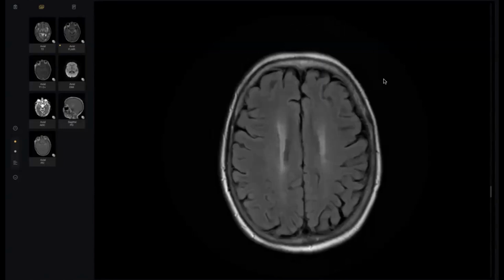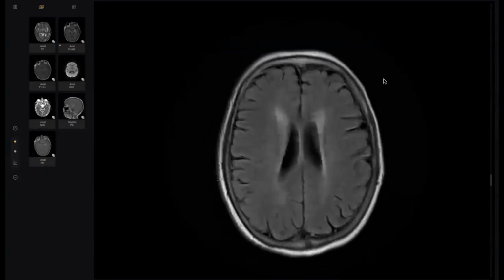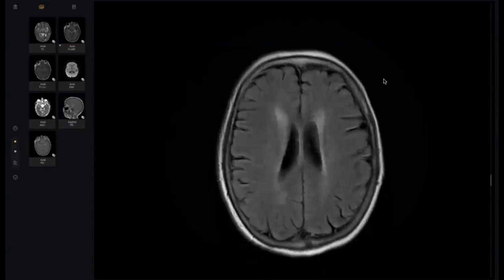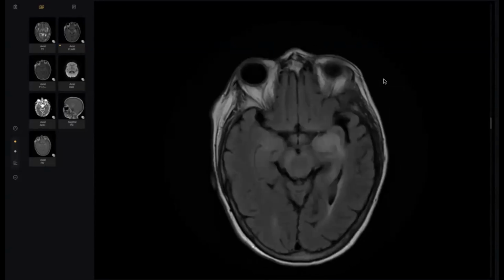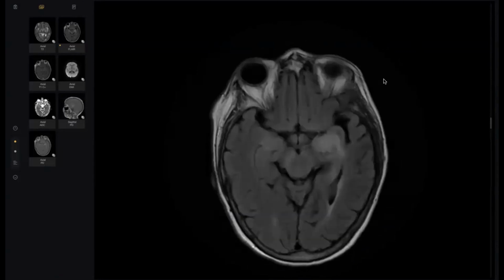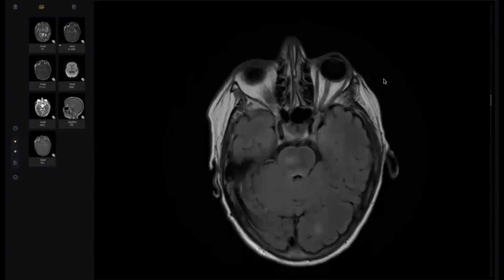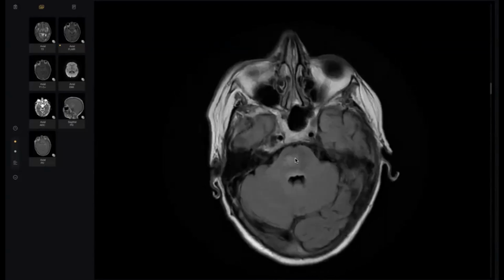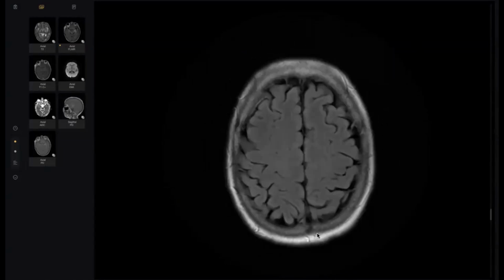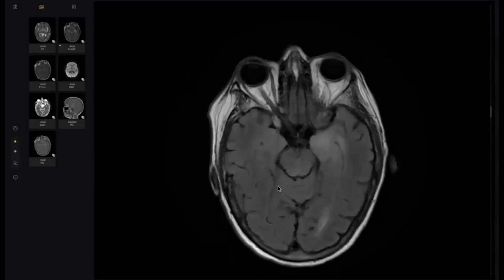Very well. My colleagues, this is a case of paraneoplastic syndrome. How to differentiate it from viral or herpetic encephalitis? Number one, by the onset. Number two, whether there is fever or not. Number three, the paraneoplastic syndrome is more scattered, affecting the brainstem here and superiorly here, more scattered than the viral infection. Thank you so much, doctor.